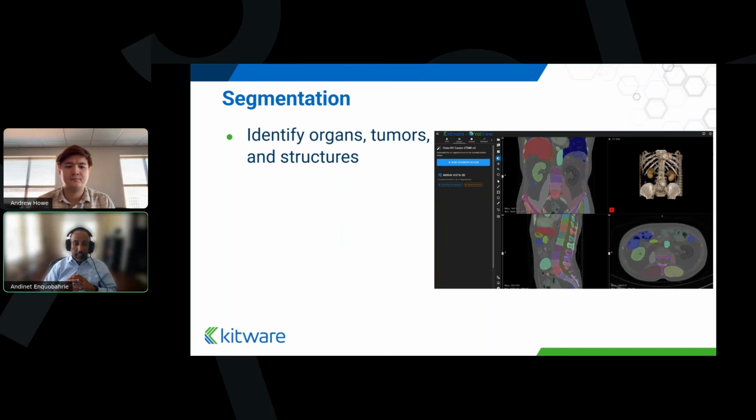And the second use case that we'll be demonstrating today will be segmentation, right? So obviously, in any medical imaging task, being able to identify the organs, isolating tumors, measuring volumes, outlining regions of interest, these are all very important tasks, right? Because segmentation would allow you to identify the pixels that are so important for your clinical interpretation.